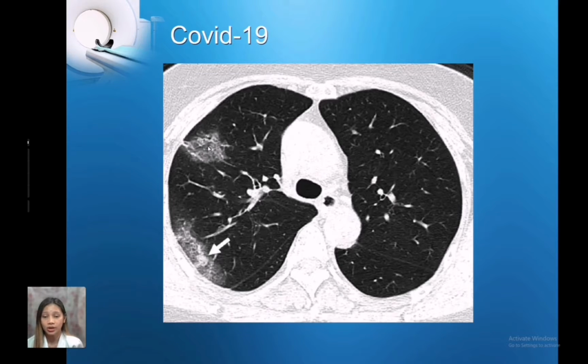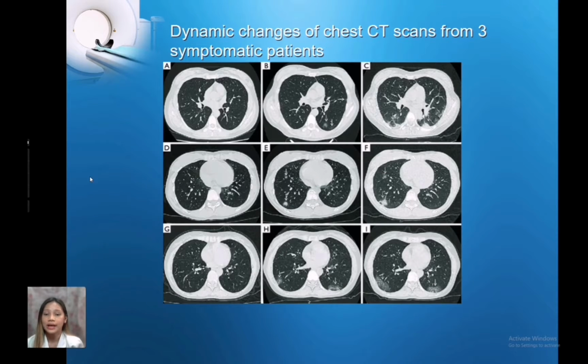I mean to say, its form is more than 3/4 of a circle. So it's not totally a circle. It's only 3/4 if you estimate it. In the computed tomography scan, it shows a ground glass, which is a severe COVID-19 infection. Sometimes they say this appearance is pneumonia, but the radiologists or physicians' findings are COVID-19 infection. For this one also, it is caused by fluid in the lungs. So it is possibly the reason why the patient has this appearance or this illness.